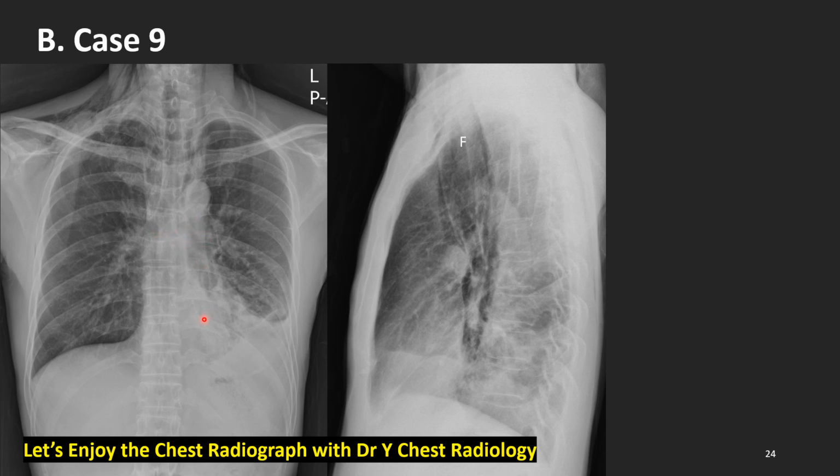On his left side, there is a dirty-looking exudate or hematoma, not transudate. On the left lateral film, there is an exudate or dirty fluid on the left side. And we see the gas in front of the trachea and along the outer wall of the left main bronchus.